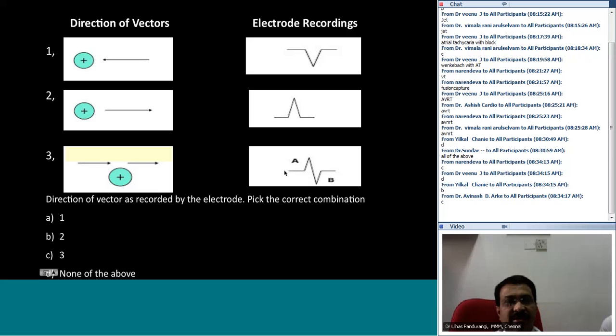This is so very essential in understanding electrocardiology, especially when you are looking at the QRS morphology and finding out the ventricular activation pattern or an atrial activation pattern, and this actually decides the axis and makes your diagnosis easy.